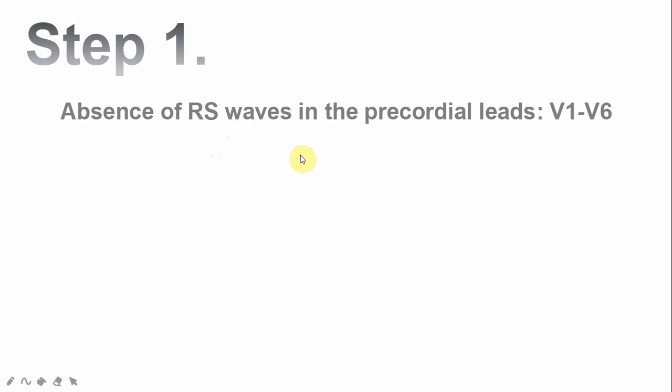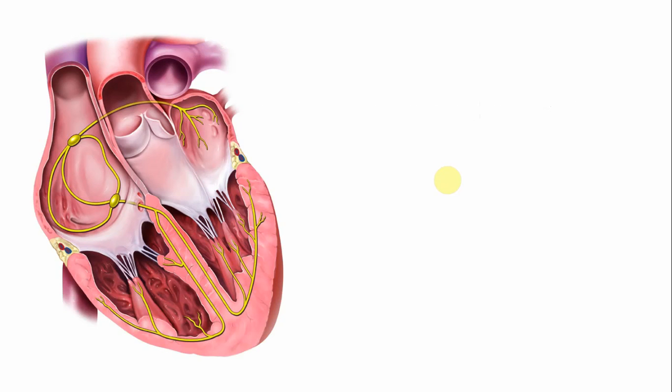Amazing, just amazing. I am loving it. Excellent. So let's have a look at some animation to explain these steps.